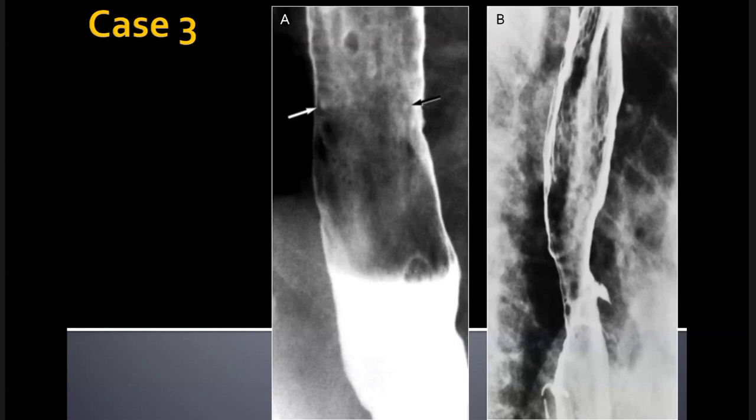So, ma'am, there is mucosal irregularity and erosions, which suggest esophagitis. My differential would be that it could be due to gastroesophageal reflux. Yeah, GERD. And second, ma'am, it can be erosive esophagitis. Yeah, possibly. Good differential.